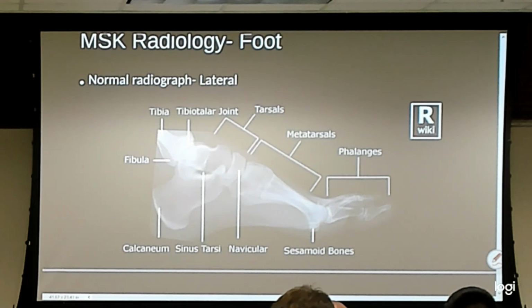Toes should align too, so it's not great for the toes. It helps us with the location of the sesamoids, which should be right there under that bony prominence of the metatarsal head. We use it a lot for calcaneal fractures and talar body fractures.